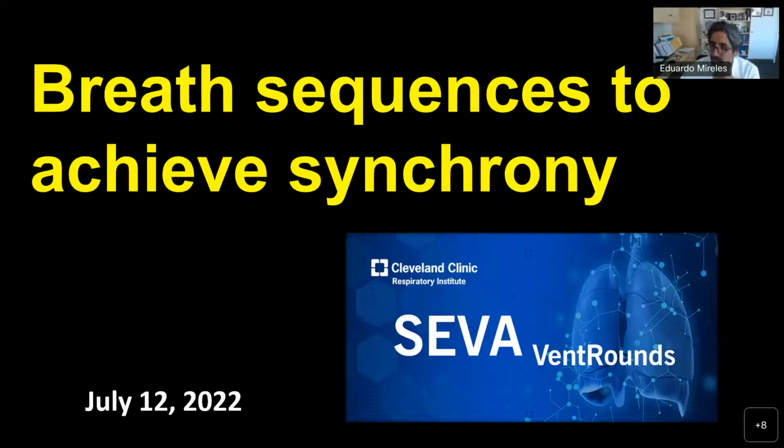All right, team. So today we have three slides actually, or three ventilator interactions that were sent by Ariel Garnero, and so I thought that these were good examples to talk a little bit about breath sequences and how this can help achieve synchrony or discordance at the same time.